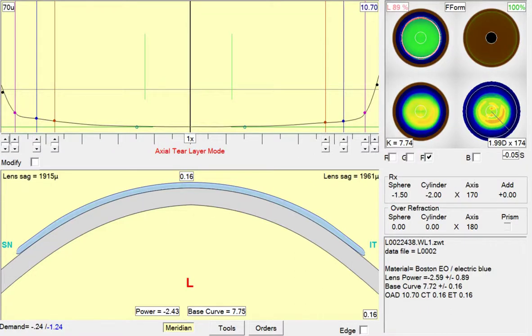In this daytime wear GP case, the patient's getting some excessive bearing nasally and inferiorly with the contact lens, with a little bit of an over-refraction as well. So one way to address these kind of quadrant-specific irregularities is to adjust the positioning of the points.